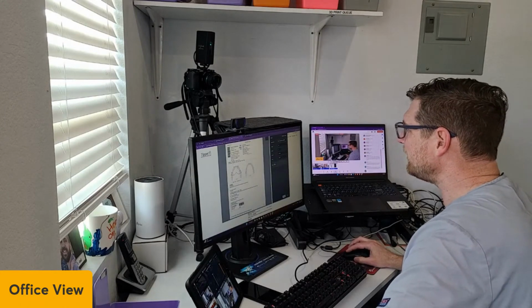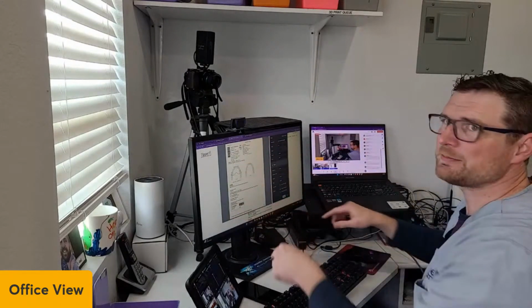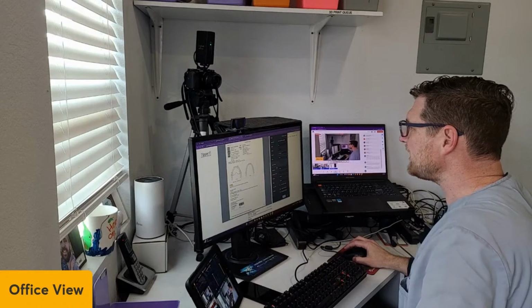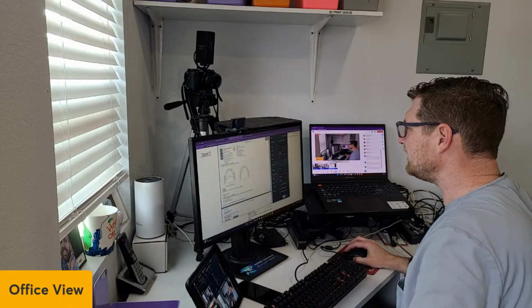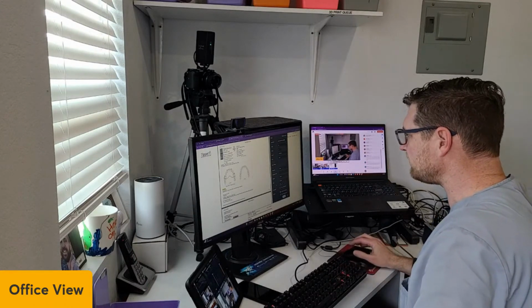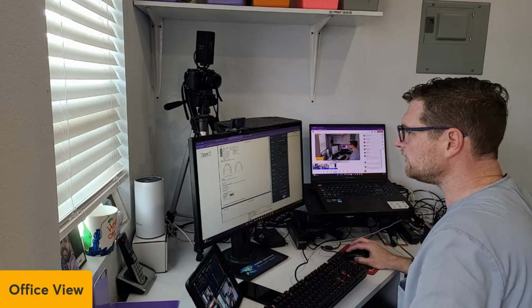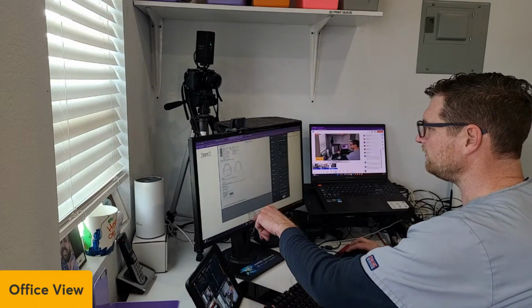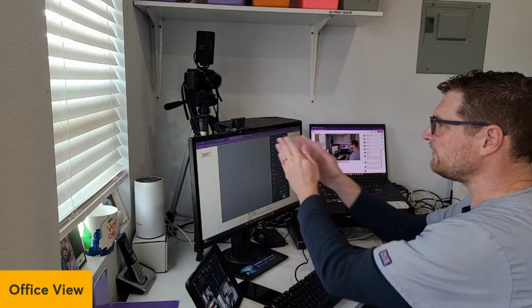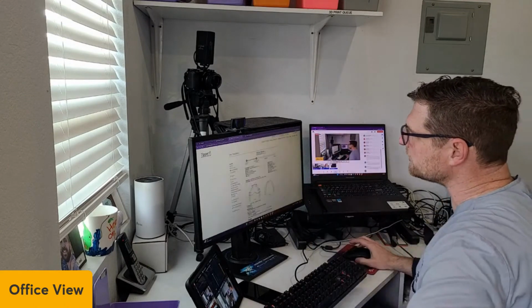All right. So this will print a full page. That's a full page 8x11 for the script. I'm actually going to do landscape, and I'm going to scale this down. I'll show you what I mean. I'm going to start with 75, and I'm going to lower it. See, it's 2 pages. I'm going to keep shrinking it and remove the headers, so I'm going to have it print on half the page. I'll show you in a minute. Let me send this to the printer, and cross our fingers, it'll print.